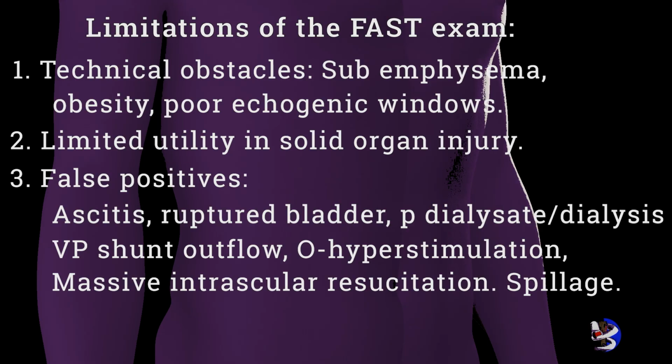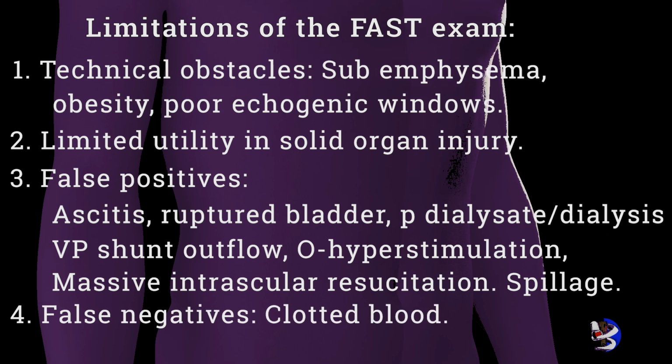The free fluid in the peritoneum may not necessarily represent hemoperitoneum, as is the case with injury to the bowel, bile, or urinary bladder, and spillage of their contents. And then we have false negatives. Clotted blood can generate various degrees of echogenicity and may be mistaken for normal surrounding soft tissue.